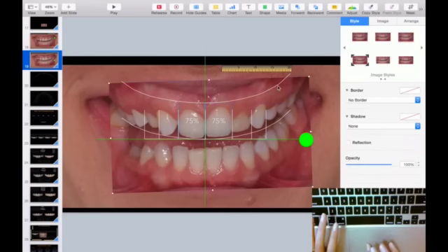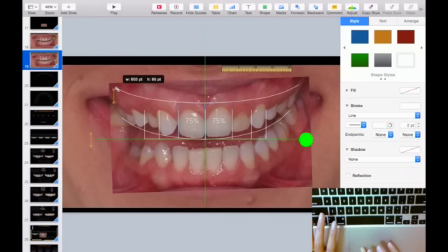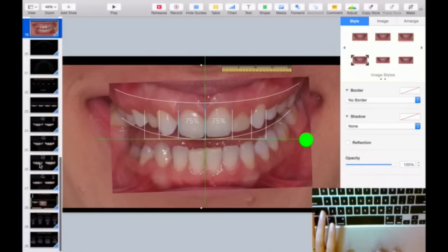So I'm going to place this here, and obviously it's not this accentuated, so we bring the edges of the curve down a bit, so I have the alignment for my gum, for my zeniths. And I think this is pretty much it. And now I can start placing the contour of my teeth.